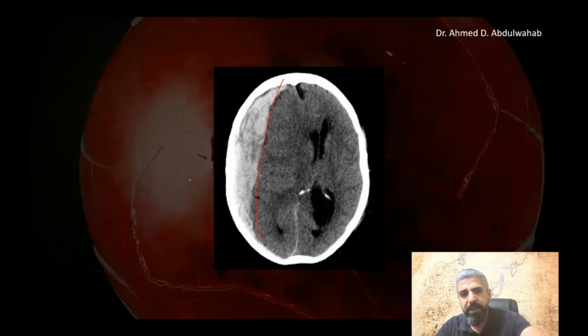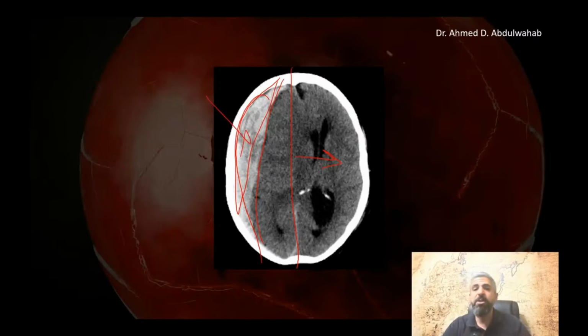This is again another subdural hematoma all over the cerebral hemisphere, and it's causing mass effect. Again, it's causing midline shift to the opposite side. This is very serious, very dangerous. This is dense. Dense means fresh blood, means acute, and this is a very serious type of subdural hemorrhage. Again, it's causing midline shift, and it's acute, indicating it might go larger.